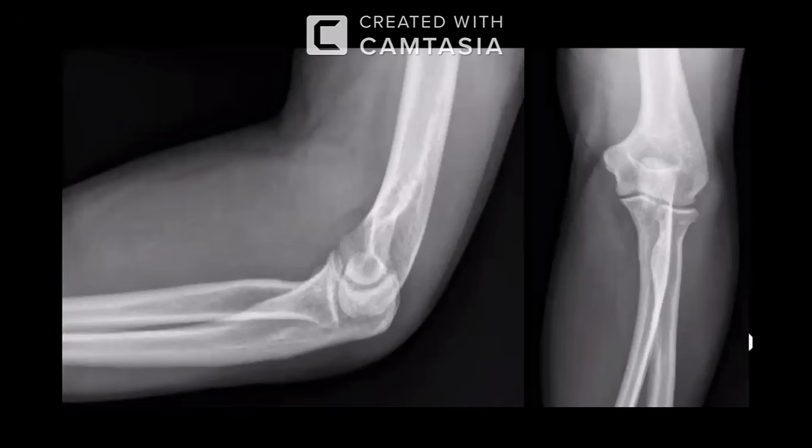I'm provided with a frontal and lateral radiograph of an elbow of a slightly mature patient. On the lateral radiograph, I can see there is an elevated anterior fat pad, suggesting the presence of an underlying fracture. I'll follow the anterior humeral line and the radiocapitellar line. The radiocapitellar line intersects the capitulum and the anterior humeral line intersects the capitulum. However, I'm suspecting on the lateral view that there is discontinuity and cortical disruption along the radial head. I'll also examine the AP view.